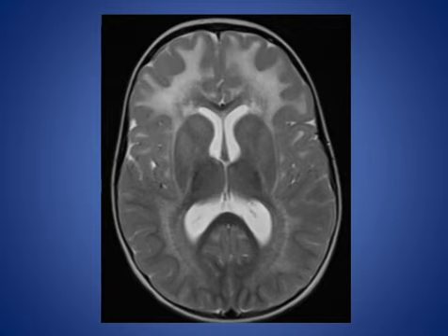The next case, this child presented with abnormal developmental delay, seizures, and stiffness. The child is a girl, 4 years old. We see here bilateral, almost symmetrical increased signal intensity in both frontal areas on these T2 weighted images, and this is Alexander leukodystrophy.